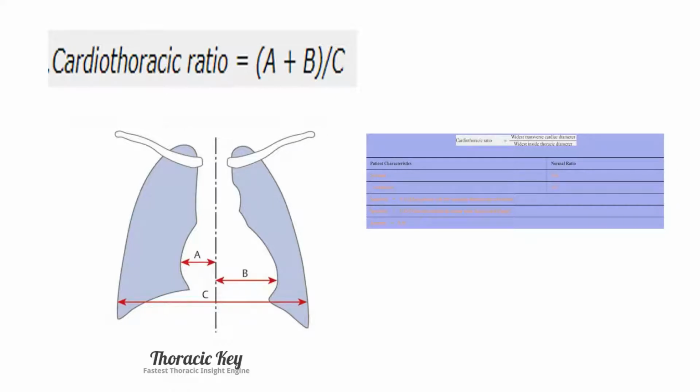Any tilt or rotation in the patient is going to magnify the cardiac size because it leads to obliquity in the heart. So the quality of the chest X-ray has to be straight. The patient is standing straight. If he is tilting to one side, stuff like that, leading to a malrotation problem and an orientation problem, also the heart is going to be magnified.